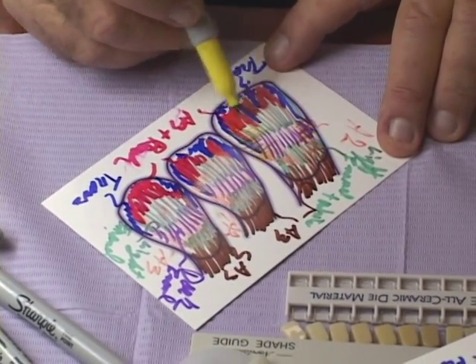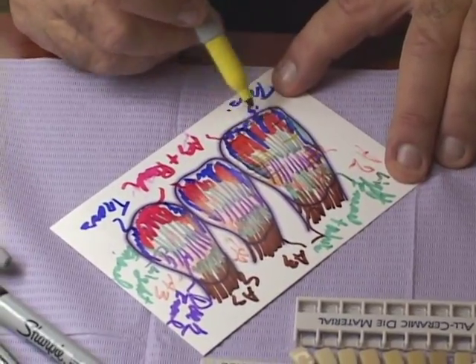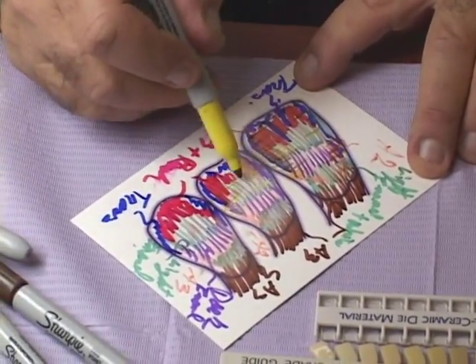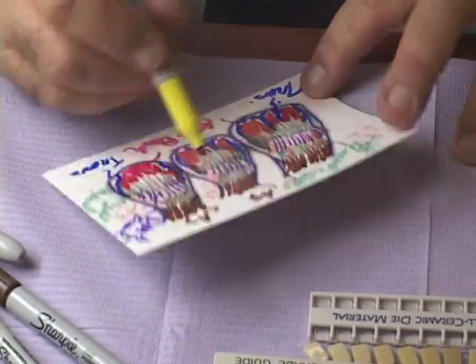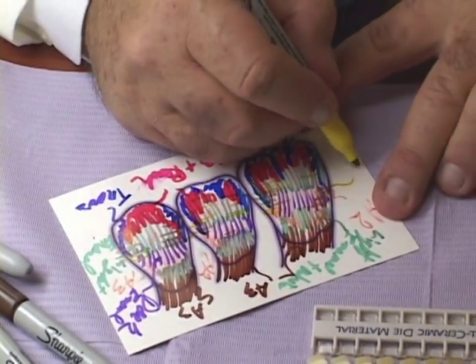And the final thing to establish is whether there is any superficial coloring, such as horizontal white lines or haze or any kind of hypercalcification areas, and we mark it with a yellow pen that describes external stains. So there may be some white lines horizontally in those areas, and we mark it as white stain or 101, which represents the color of white stain. So this is what we end up doing.